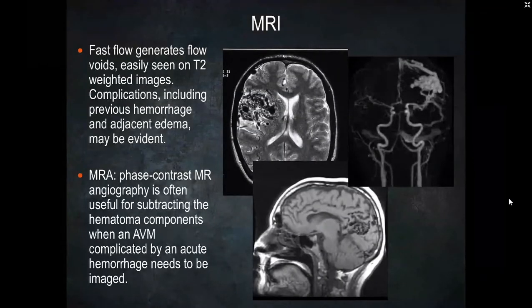But why is MRI better? Because MRI gives us better tissue resolution, and you can observe the nidus much more easily. So here is the nidus in the axial MRI T2 image. It's seen as a big nest of vessels with loss of signal, causing a little bit of mass effect, because we can see compression of the right lateral ventricle.